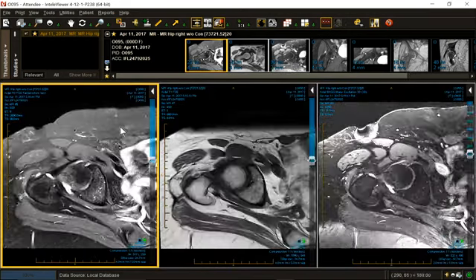Now, it's nice to have an orthogonal up to figure out where you are, so I'm going to put one in the middle. And as Michelle and Barack Obama would say, when they go low, we go high. So let's go high, because that's where the tears are. And when we go high, we've got some abnormal signal scattered around the superior acetabulum. Quite a bit of it.